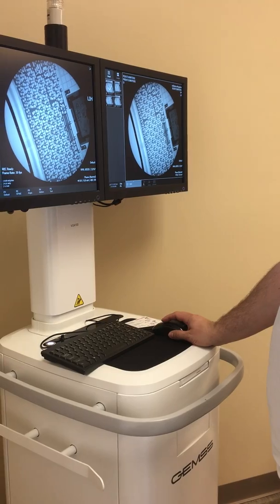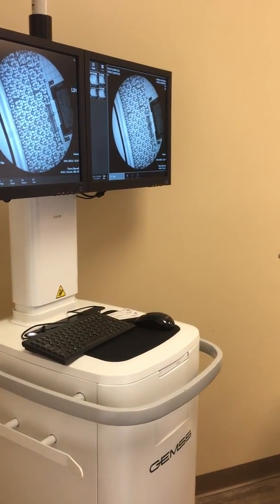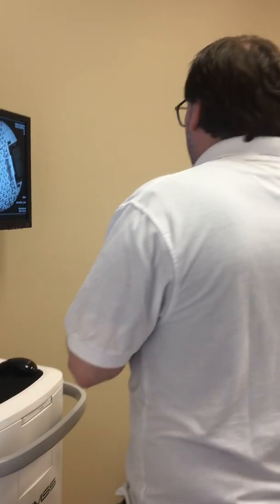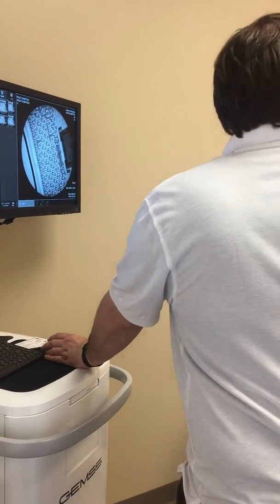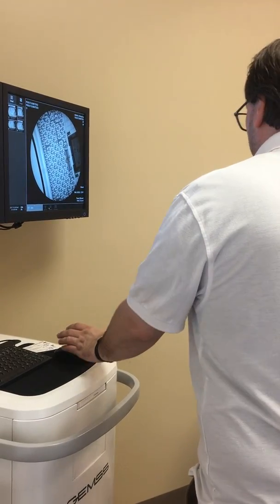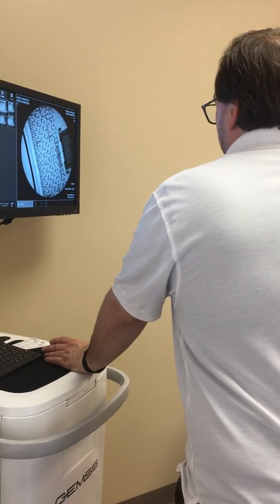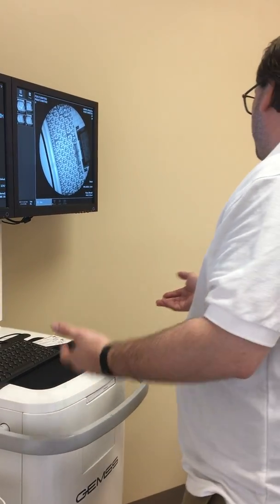But basically, they allow you to acquire a DSA Cine loop, and you can remask that Cine loop after it's been acquired. You can landmark that Cine loop after it's been acquired, and you can adjust how much the pixel shift is, so it highlights that image more or less. There's a lot of functions that you're not really going to use on a day-to-day basis.